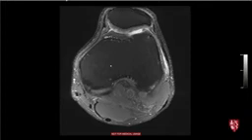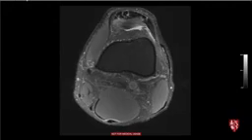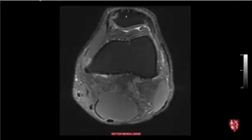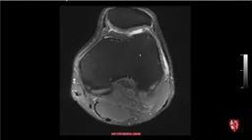again, we'll start at the top and go down, and you can see the quadriceps tendon here coming down. A little bit of signal like quadriceps tendinopathy, mild degeneration, is extremely common, often asymptomatic. Medially here, you have more muscle. That's the vastus medialis obliquus muscle, component of the vastus medialis. So that's a good clue that you're medial. Another good clue as far as medial and lateral goes is the lateral patellar facet is longer. So this longer facet, that's going to be the lateral facet.